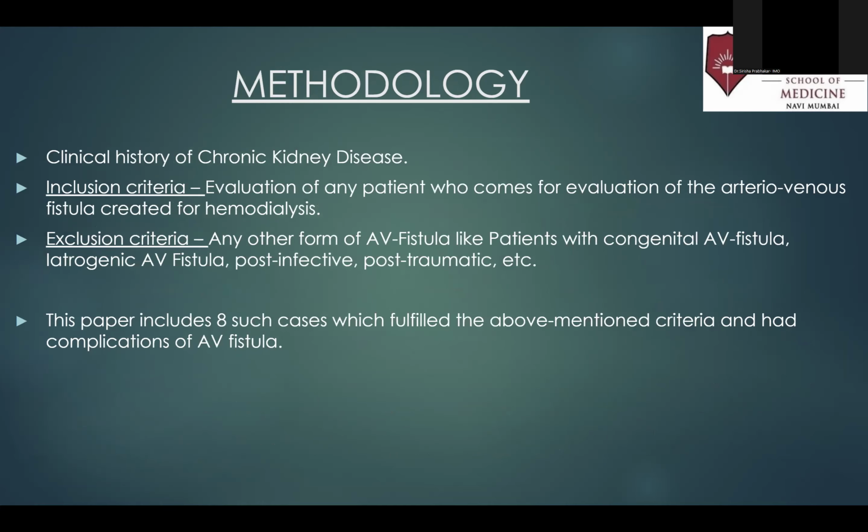Our study included patients with a clinical history of CKD. The inclusion criterion was evaluation of any patient who comes with AV fistulas created for hemodialysis. Exclusion criteria were patients with congenital AV fistulas, iatrogenic AV fistulas, and post-infective or post-traumatic AV fistulas. Today, I'll be sharing 8 compelling cases demonstrating these complications. Each case taught us something valuable about the power of Doppler imaging.